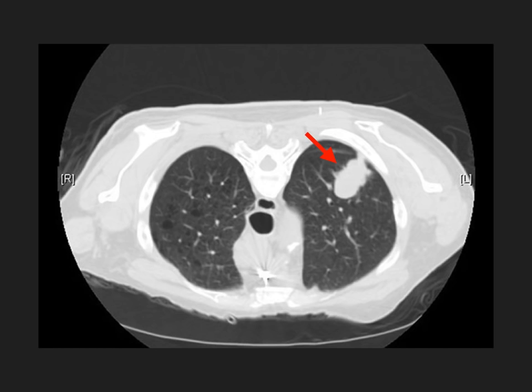There are plenty of other CT films that you can look at for practice, but again, those are the highest yield.